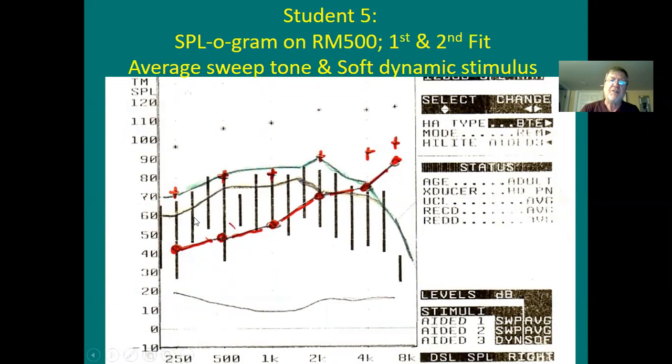This one gets kind of confusing. Don't worry about these vertical lines. I'll tell you what that was for. In the early days on this real ear equipment, they didn't have actual speech as a stimulus. They had sweep tones going brrrr, brrrr, and then when you wanted to have a speech-like stimulus, you had tones coming out like this to imitate the stops and starts of speech.